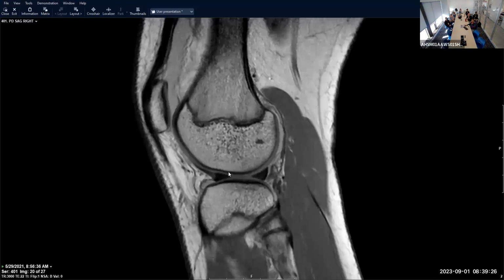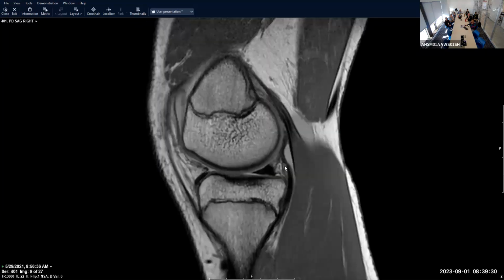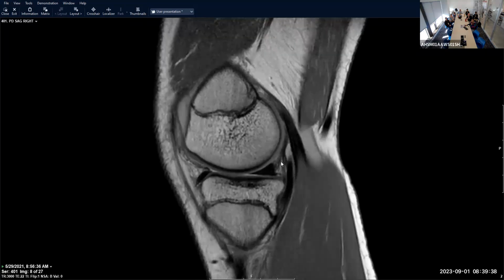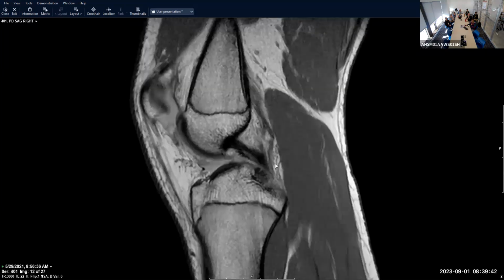Okay, so meniscocapsular separations, particularly also in the setting of ACL tears. We don't have one in this case, but ramp lesions, which is just a peripheral tear of the medial meniscus posterior horn or meniscocapsular separation. I'm always looking for those, particularly in ACL tears, because there's an association between those two.